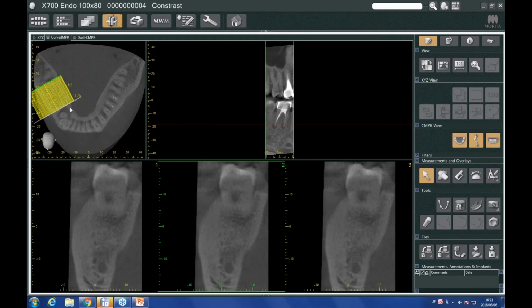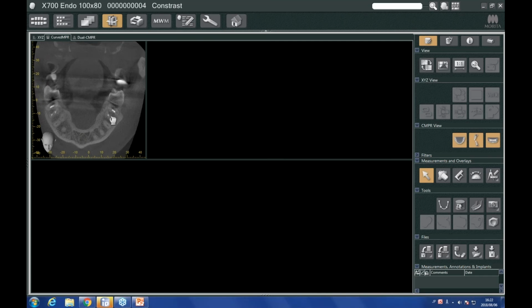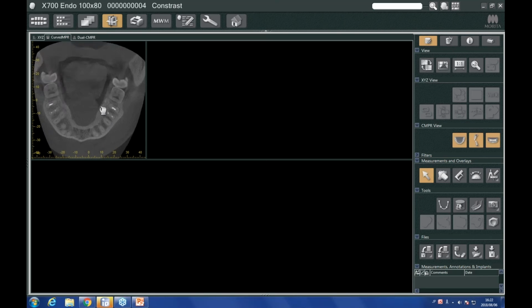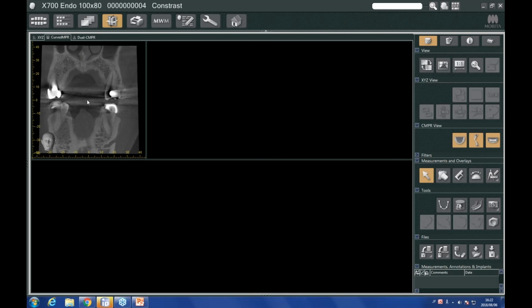In the same way, for endodontists, we're not necessarily tied to this dental arch. Once the spline is removed and the image is just the way it's shown here, I can left click and pull this up to be more of a patient front orientation. This is just me moving the image, basically grabbing the patient's chin and lifting it up. Now, this particular image may be a little difficult to understand.